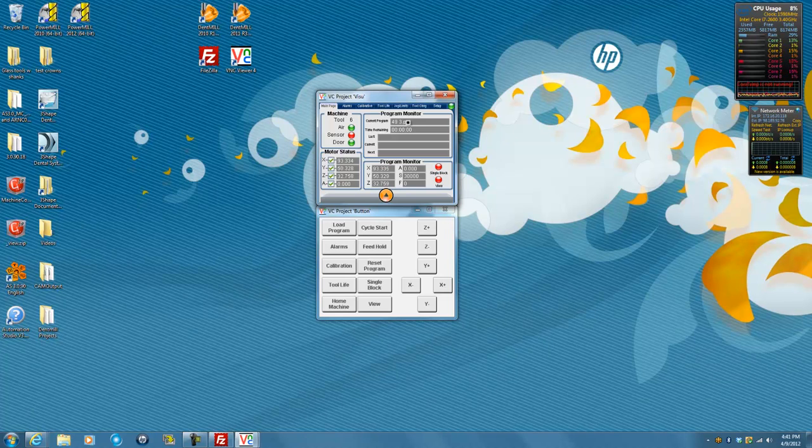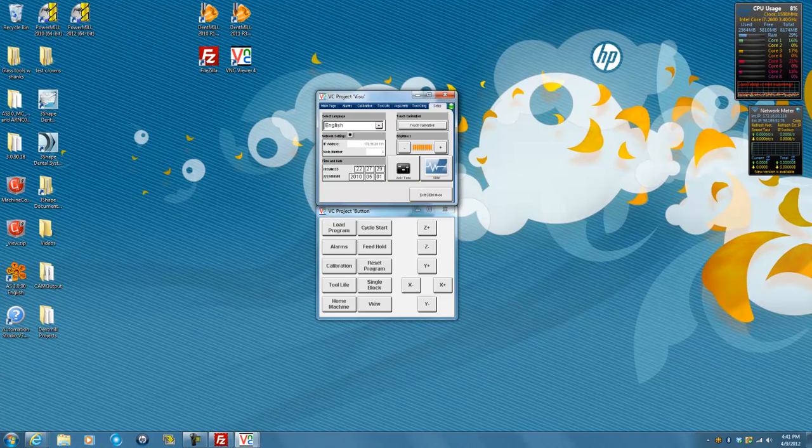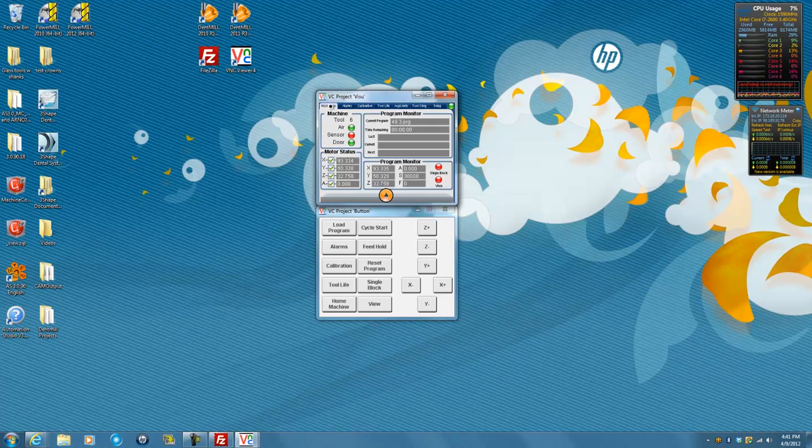And we don't really want you running the CNC machine from your PC, but you can see here that for service, now the technicians can get in and access your CNC machine from here. It's also nice to be able to view if the machine is finished or not, and now you don't have to get up from your desk. So this is how you can use VNC Viewer and FileZilla to transfer files back and forth to your milling machine. Again, this is all using your IP address that's here in network settings, in our case 172.16.20.111, to access the CNC controller.